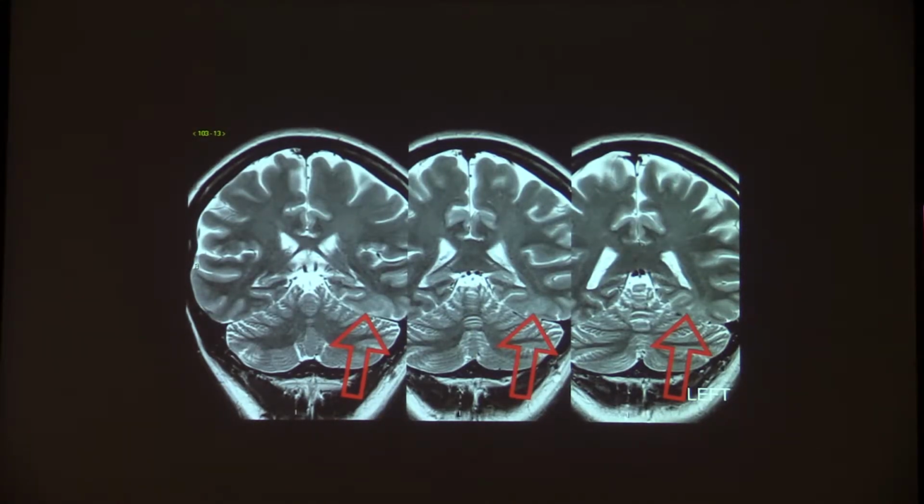So on coronal T2 weighted images, you see the fusiform gyrus. The fusiform gyrus is a really interesting area of the brain because that's the part of the brain that is responsible for object recognition, face recognition. So you look at me, and next time I see you, you would hopefully recognize me. And that's the area of the brain that will light up, saying, ooh, that's the guy that messed up the DTI lecture. Or if you see a cup, you know that it's a cup because that area of the brain is lighting up, okay?